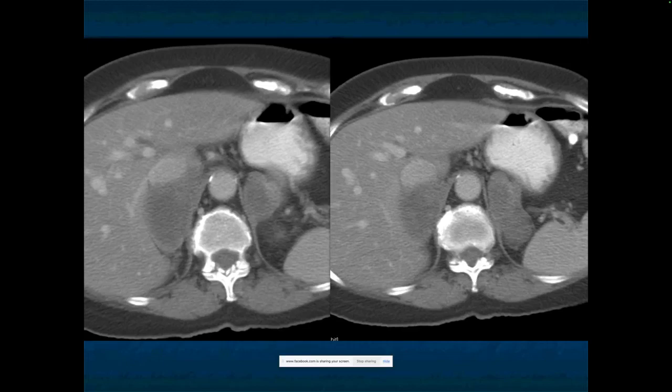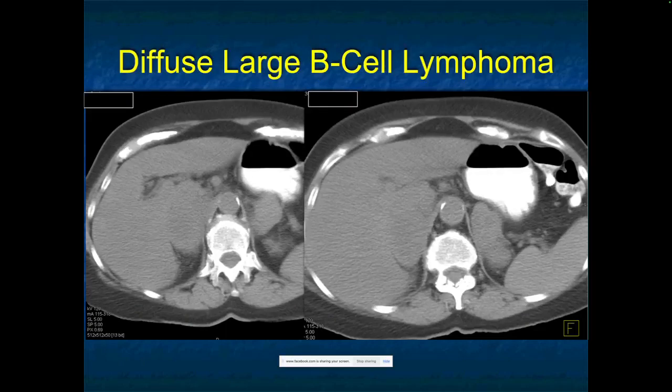They don't look like adenomas. They're not cysts. Could it be metastasis? Definitely yes. In the right history, could it be PHEOs? PHEOs are usually more vascular. PHEOs can be bilateral in 10% of cases. But with this shape, you also need to think about lymphoma.